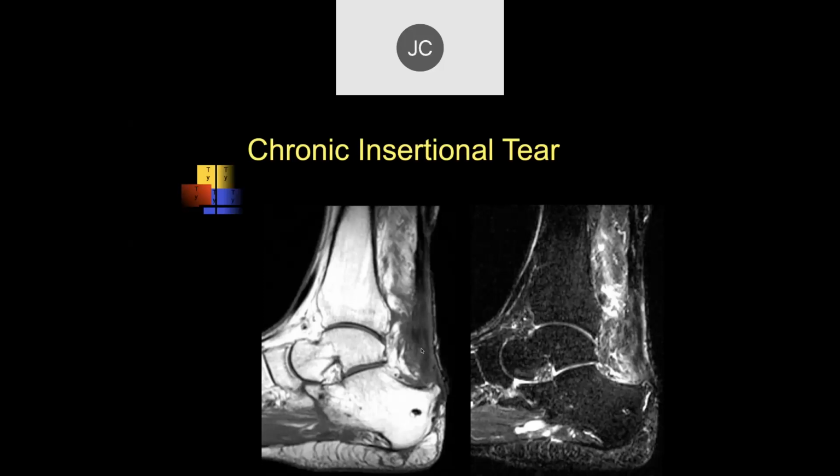It'll retract a little bit, scar formation will occur, and you'll have proximal migration of the musculotendinous junction, and you'll have what looks like an intact tendon, though most of this is just scar tissue. So this is scar in situ. There's really no true connection here that you can rely on, is there, John? Not really. I don't think this is good quality scar.